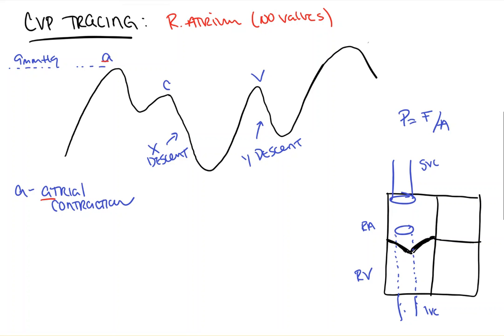Now we should note that anytime a patient has a stiff right atrium, you're going to have a larger spike in your pressure. Why is that? Because less compliant things are unable to tolerate changes in volume. So small changes in volume have major changes in pressure.